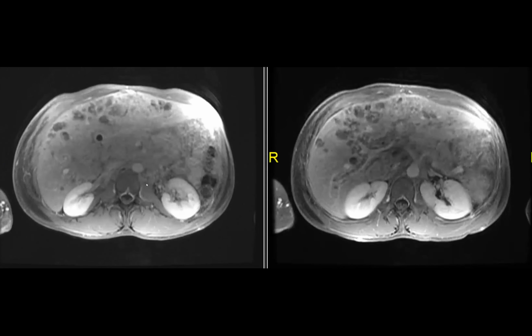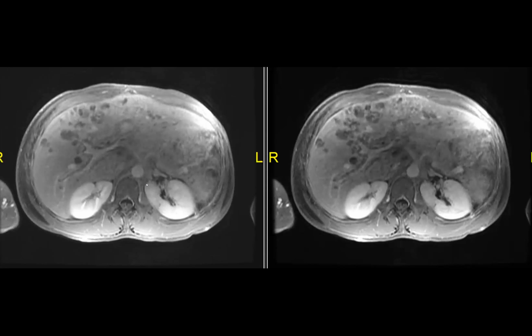You know how you get flame-shaped, infiltrating lesions. It's the same thing. It likes a perivascular distribution. So in the abdomen, it goes along the portal vessels, and then along the mesenteric vessels, and also in the groins, you'll see soft tissue growing along the groin vessels. I missed, what is the primary? Kaposi.